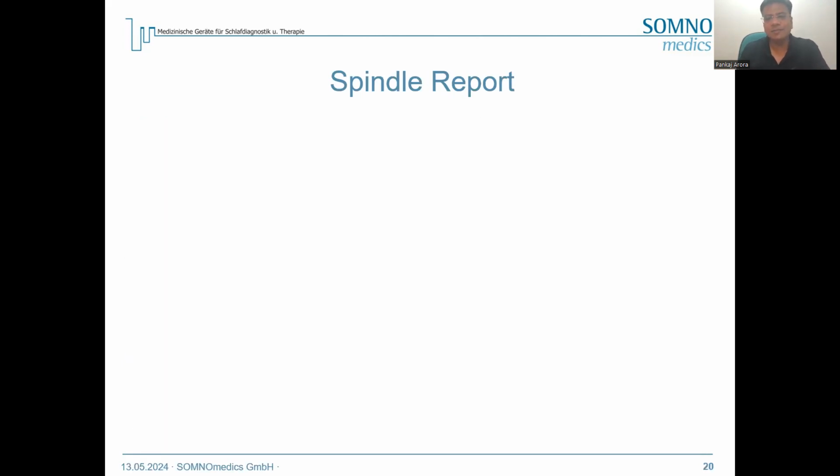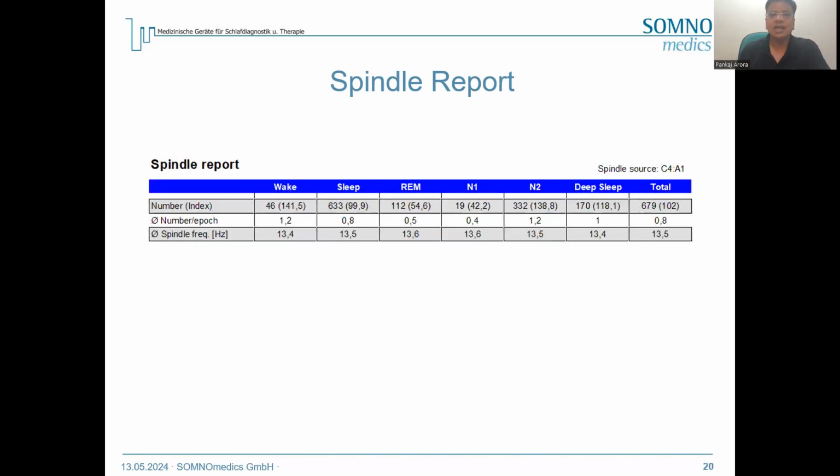Now, spindle. Why is the spindle report important? Sometimes a patient is taking some kind of medication, especially for depression or insomnia. These medications can cause more spindles. So what is basically a spindle?